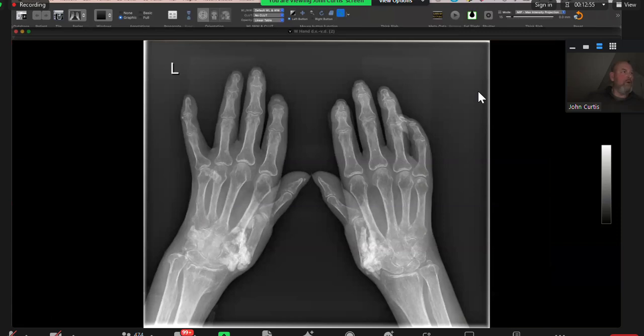Okay, so Bhumika, have a look at those hands. Let me give you remote control. Okay, now I have the control. So I'm provided with the radiograph of both hands, frontal projection of a skeletally mature patient, in which I can appreciate that there is an area of soft tissue calcification noted, predominantly along the carpometacarpal joints.